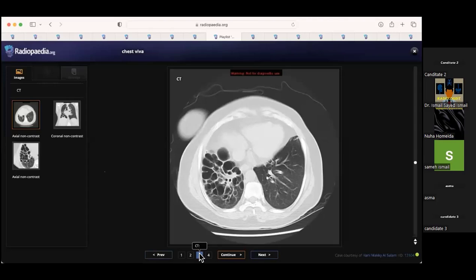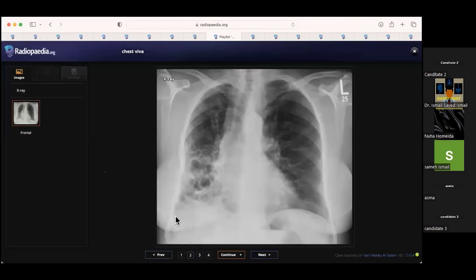Other differentials could be primary ciliary dyskinesia, could it be alpha-1 antitrypsin? All these are differentials, or obliterative bronchiolitis. So well done. Yeah, so that's just a cystic bronchiectasis. They really love bronchiectasis, and it cropped up in the exam a couple of times. So just know your differentials very well for bronchiectasis, and try to be concise whenever you pick an abnormality. Describe it well, look for any complications, say to the examiner the causes, sum it all up from the x-ray and then ask for the CT. But well done.